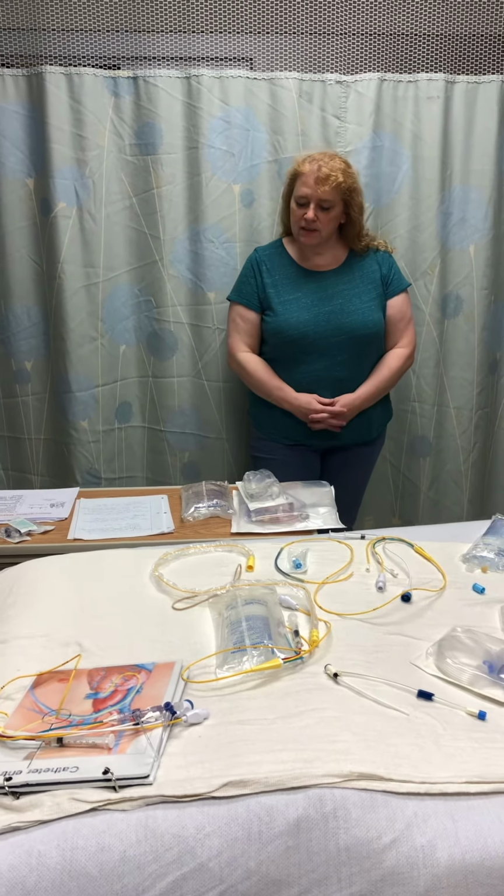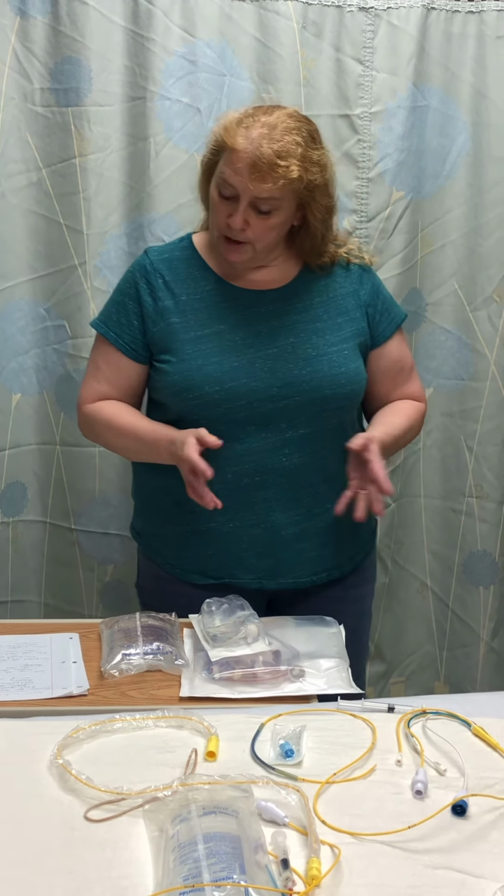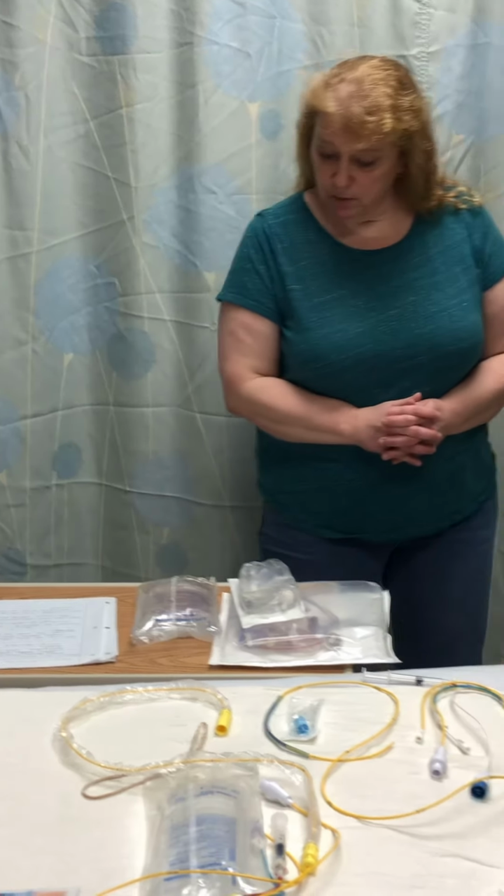So what are some of the reasons for the Swans? We get Swans that are going to help us guide therapies, most commonly in our open heart patients, but sometimes they'll come back from cath lab with a Swan in place. They may want to get a better picture of how to tailor their therapies in someone with heart failure, some pulmonary hypertension, maybe acute MI with some cardiogenic shock, maybe optimize some diuresing. So that's some of the reasons, and we just want to give you the basics here.